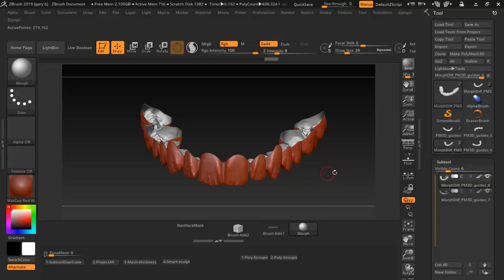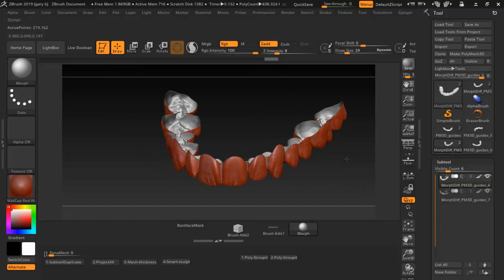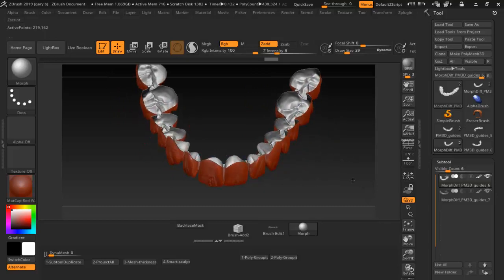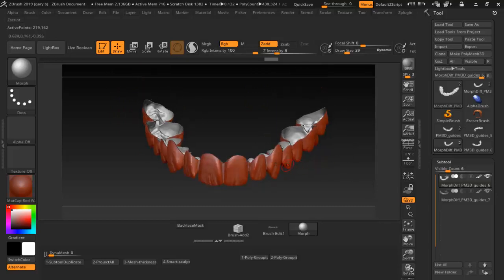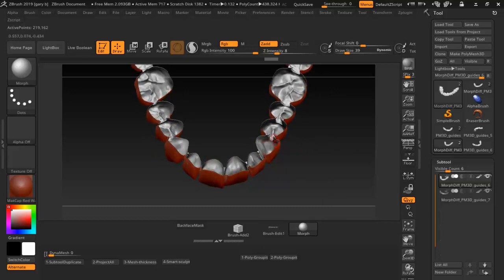Then once you get these made, you can go ahead and send these files. I have a link in the README text in the zip file you can read, where you can upload these files and have them printed out or whatever you want done. So these snap-on smiles, what they do is they snap onto your original teeth. Alright, for them to fit on your teeth, you cannot edit the inside.